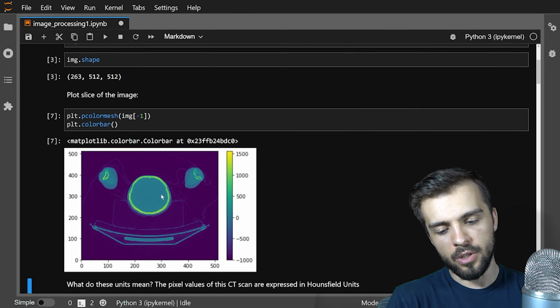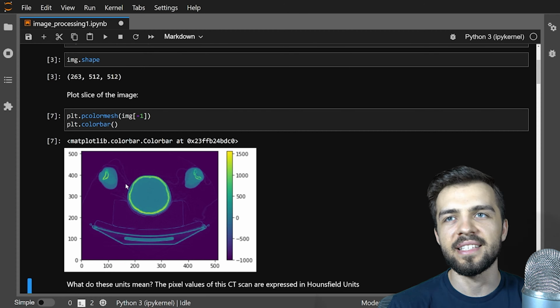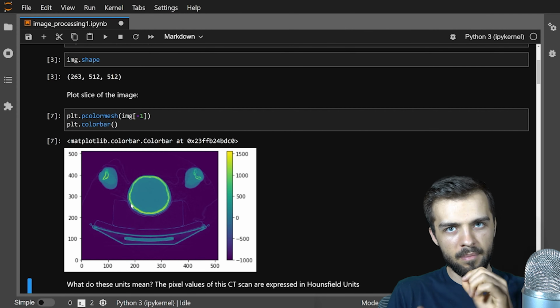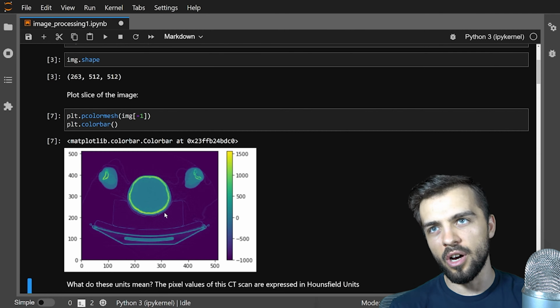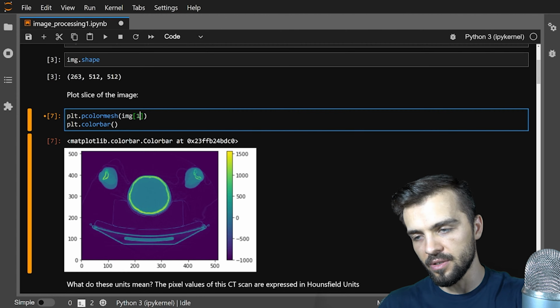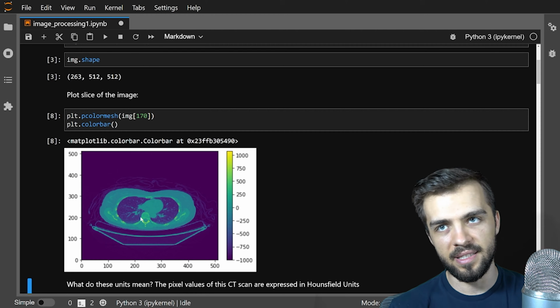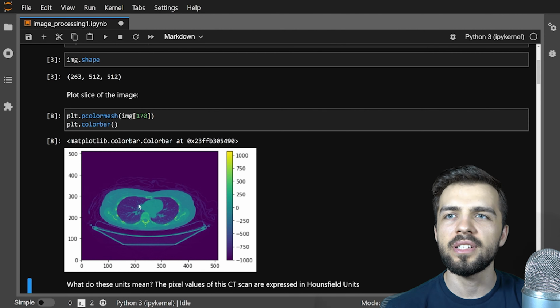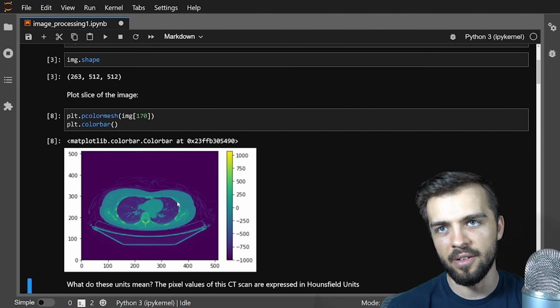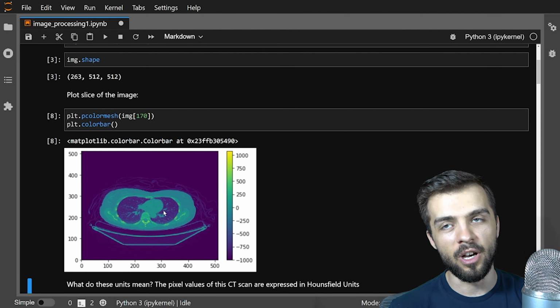What we want to do is we want to get a mask of the lungs in the person. We want to take this image and we want to find a corresponding 3D array where 1 means you're inside the lungs and 0 means you're not. This is getting a lung mask from an image, and of course it's not going to be easy to do, because you can see that if I wanted to segment the lungs like this, that's what we're doing, it's segmentation here. There's all this stuff in the center of the lungs too, and then maybe there's air out here, and how do we differentiate between air and all the other regions? And so I'm going to show you how to use all these libraries to do a fairly complicated task.